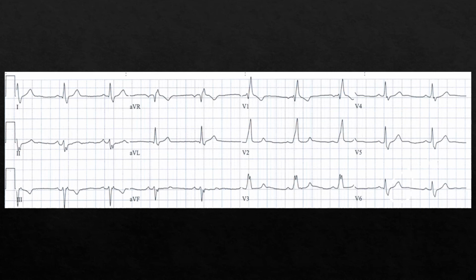Okay, here's another example. We have a right bundle branch block again. V1 is upright, wide with an RSR prime pattern. You have a V6, which is positive in this one with a slurred S wave. And then so that'll give you the criteria for a right bundle. We look over to the hexaxial leads. We have a left axis with a QR wave in 1 and AVL with an RS wave present in 2, 3, AVF. This is another bifascicular block.